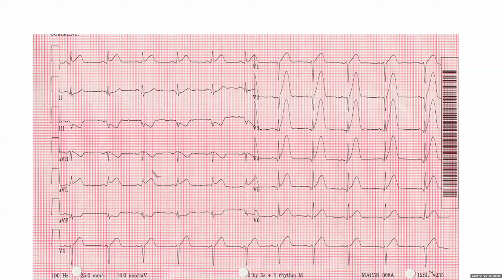Exactly. So these are hyperacute T waves, which precede the ST segment elevation sometimes. And classically, you have two things. One, the base of the T is very broad, wide, symmetrical. Yeah, good for you. Unlike the hyperkalemia one.